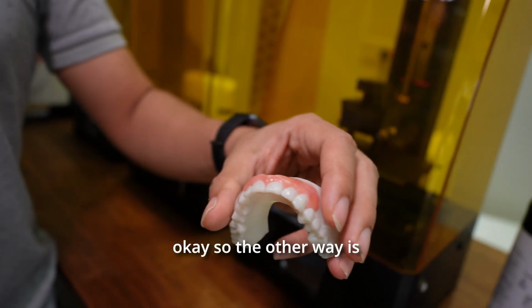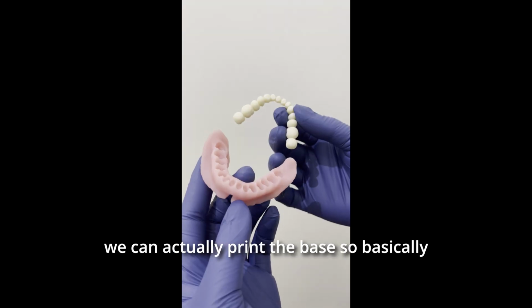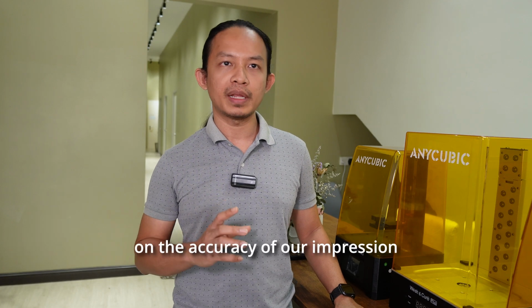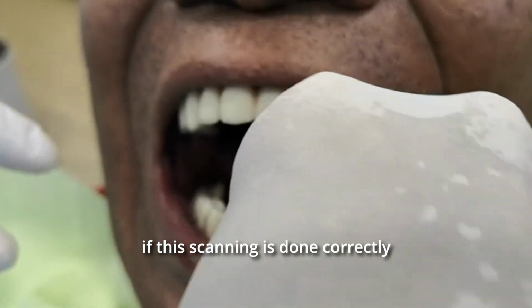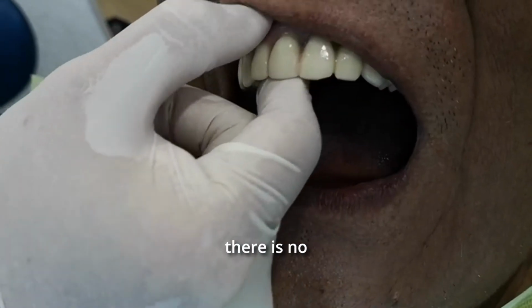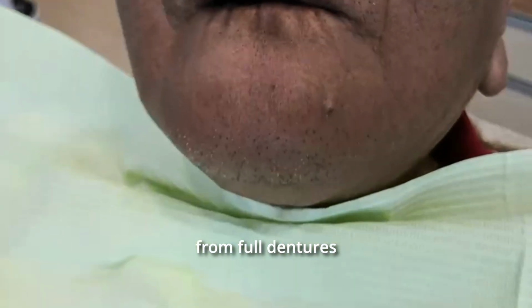All right. Okay. The other way is we print it separately. We print the teeth first, which I don't have a sample of here. Once that's done, we can print the base. It's almost like a Lego form. You literally just pop it in and it fits. The fit really depends on the accuracy of our impression. If our impression is correct and the scanning is done correctly, it should fit fine. That should not be a worry at all, right? Compared to an analog one, there is no big demarcation. Not really. It should be similar. You should be able to get proper suction from full dentures.